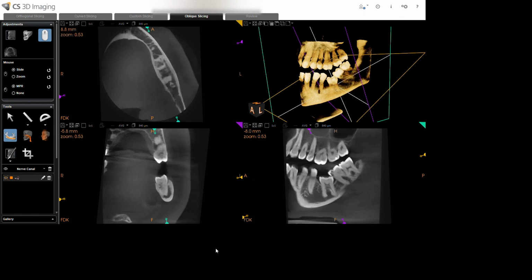Okay, so this is a small case of a submerged tooth which I have shown here. If you have any queries, or if you feel like anything, we'll move on to the next case in the next round. But by that time, definitely message in the comment section whatever you feel.